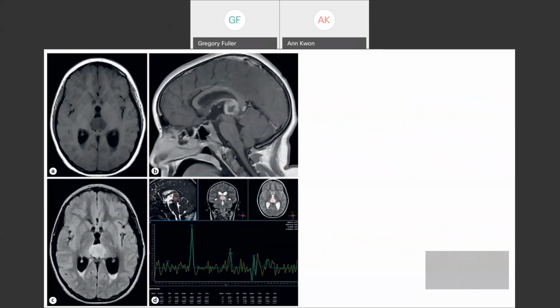This is the imaging figure from the study, and you can see that we even include the MR spectroscopy, the lower right panel, all right? And you can see that the elevated choline is very cellular, all right, diminished creatine, and NAA, and there's even here a lipid lactate peak. So we're being very thorough.